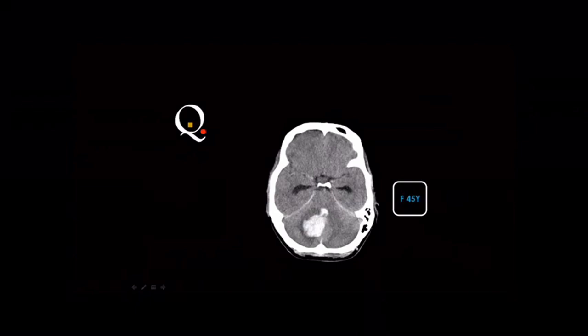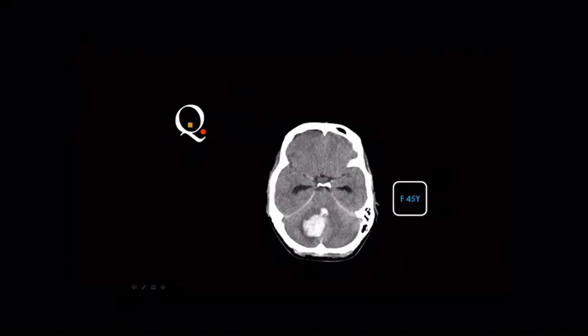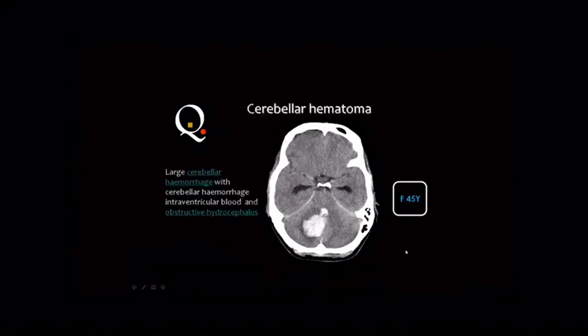Hemorrhage. Yes, this is very important because many times I show this example in the exams and I get very strange answers. The cerebellum is the second most common site for intracerebral hematoma after the temporoparietal area. If you see a hyperdense lesion in the cerebellum, think of hematoma, and this hematoma can extend inside the ventricle, similar to any other hematoma in the brain.